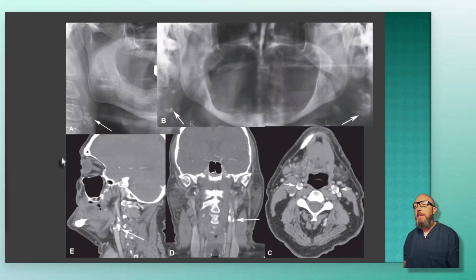All right, here's some examples. And you've got to compare these with, is it just a part of the hyoid bone? Is it part of thyroid cartilage calcification, which we'll talk about later? But it's really irregular, ill-defined, kind of goes above and below where the hyoid bone is. A lot of those things are telling you that this is a carotid atheroma calcification.